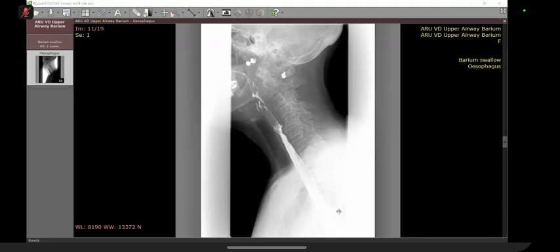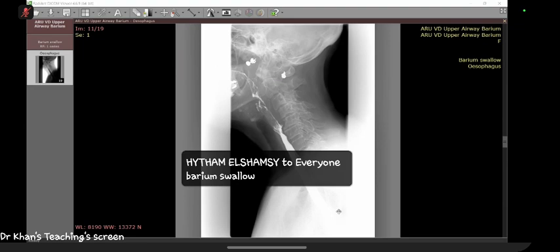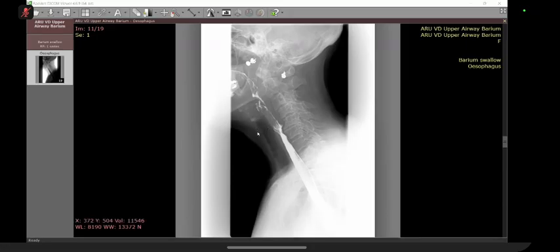Yeah, we can see. Okay, just keep looking at this one in between, right? Where is hide? This is it. Okay.